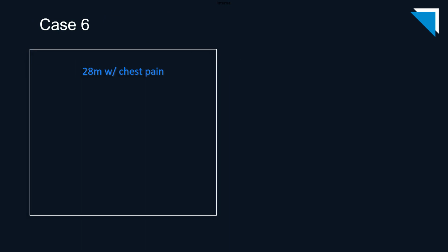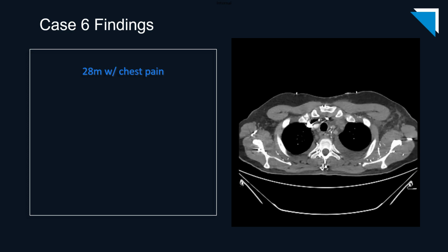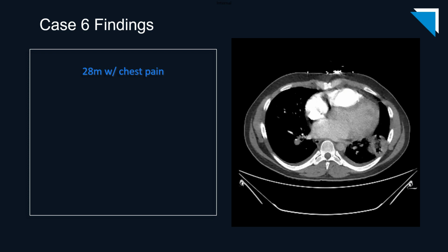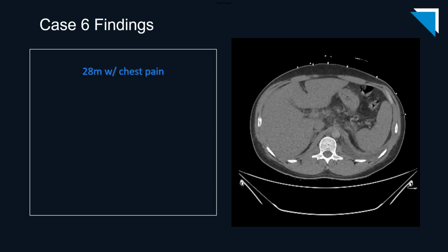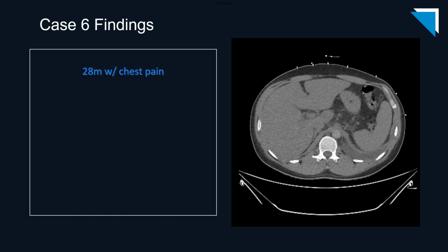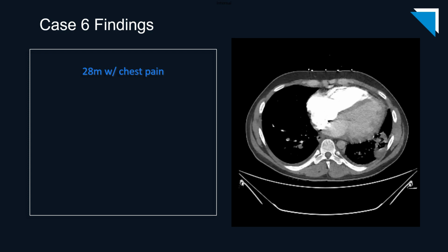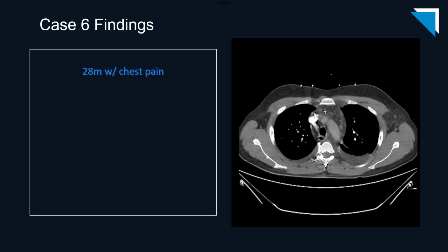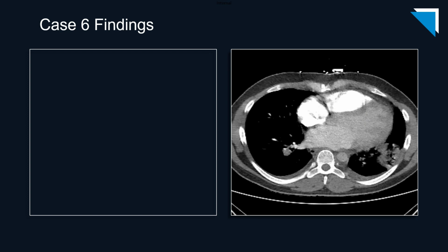Our final patient today is a 28-year-old man with chest pain. These are axial images from a CT angiogram of the chest. Reviewing our findings.